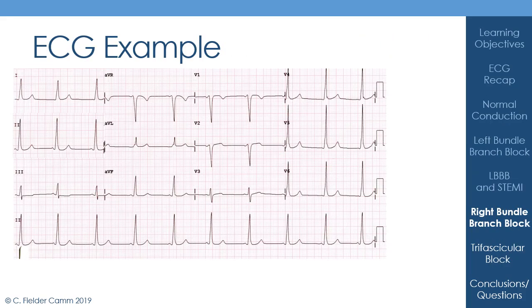Okay, so here's another ECG example for you to go through. Take a moment to pause the lecture, and then I'll go through it with you afterwards.